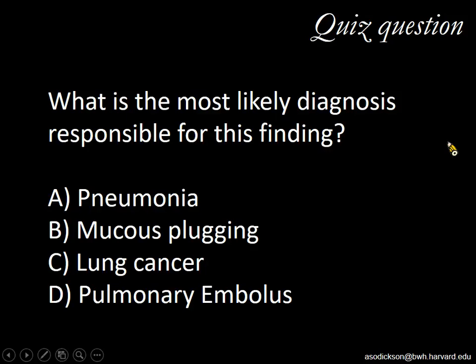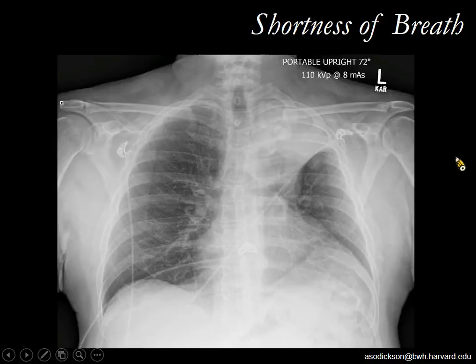All right, I picked a good question, or a tough case. So we have some pneumonia. The largest one looks like we're split between lung cancer and pulmonary embolus. Good. All right, this is a tough case then. So the key thing I want you to look at here, this is left upper lobe collapse. You can see that the left upper lobe is squashed medially against the spine here.